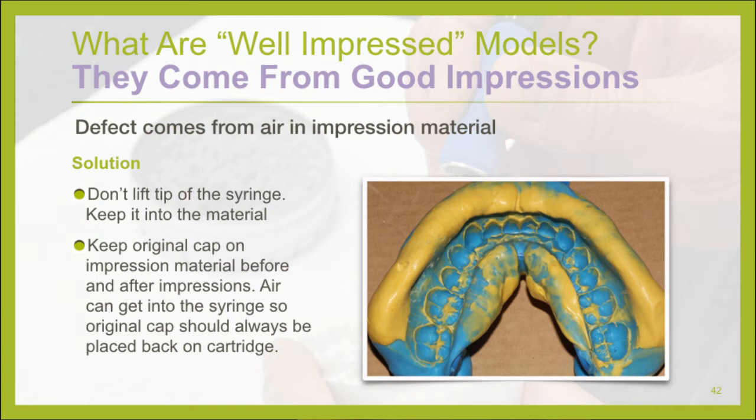The next thing I want to talk about is putting the cap back on. After you're finished with the impression and you have extra material left over, a lot of times we think, well, we're going to be more efficient by just putting a new tip on, putting it in the drawer, so we have that the next time we need to take our impressions and we're ready to go. But what we find is, and this is not my information, this is the scientists behind the material, the ones that are making the product. They have said, Shannon, put the original cap back on. Because if you don't put the original cap back on, air is still going to get into this material and it can cause you to have voids and bubbles. And last but not least, keep with the same manufacturer.